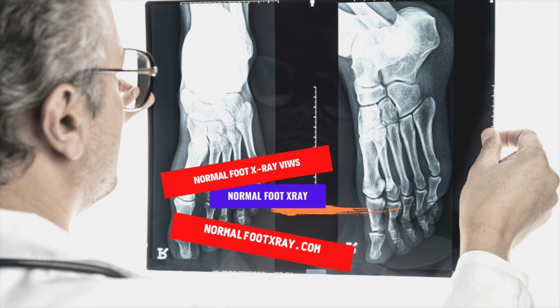A standard X-ray study of the foot should include an AP, lateral, and oblique view. The AP view is the most important of these views, because it can detect Hawkins's sign, which is a sign of sufficient vascularity in the talus. This sign can occur 6 to 8 weeks after a talar neck fracture. The AP view is also helpful in diagnosing a fractured talar neck.